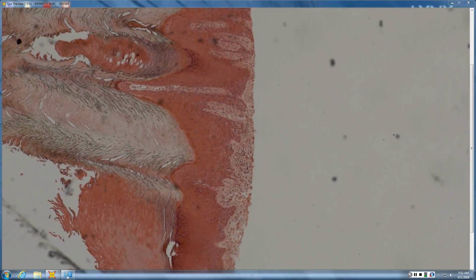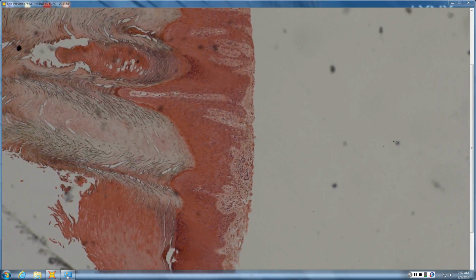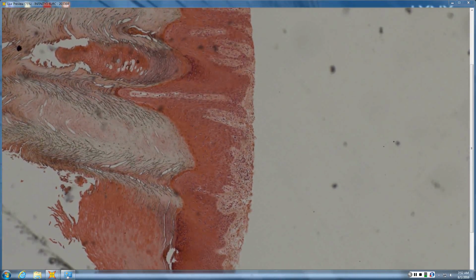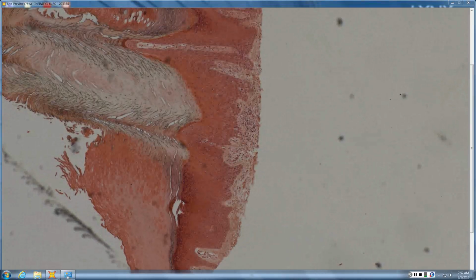They don't look like they go full thickness. I'd favor just an AK or a hypertrophic AK. So flag sign in the stratum corneum is usually overlying an actinic keratosis, sometimes overlying warts. You look at the degree of atypia. In this case, a lower grade atypia, so hypertrophic AK sounds just about right.